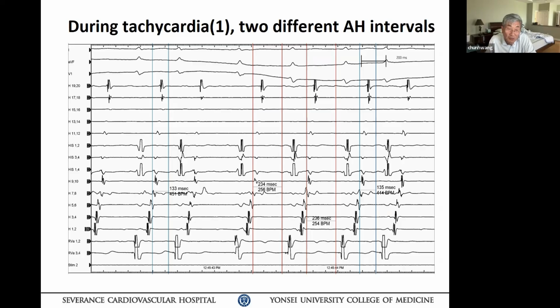If you look at the RV, there's a small right bundle potential at proximal, almost every single beat. Did they affect that? Is it faster or shorter, you think? This is an important one because it will tell you which is active and which is a passive bystander.